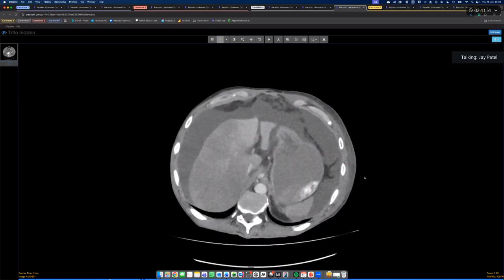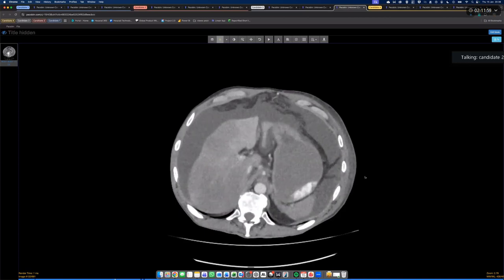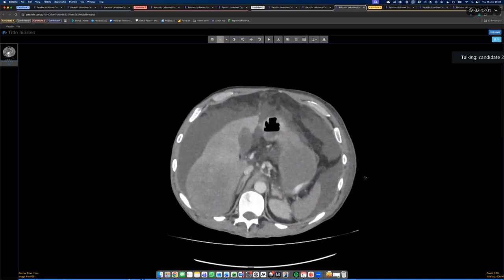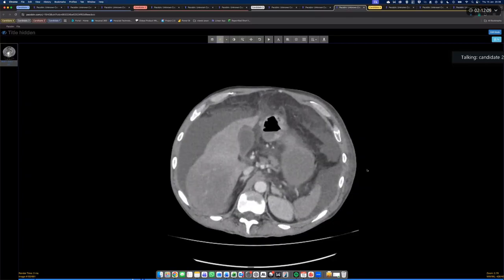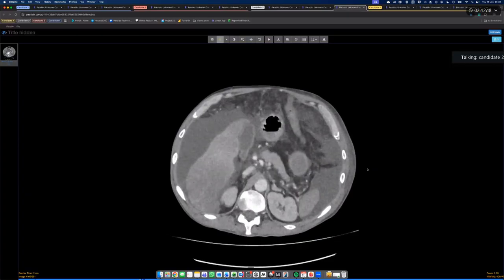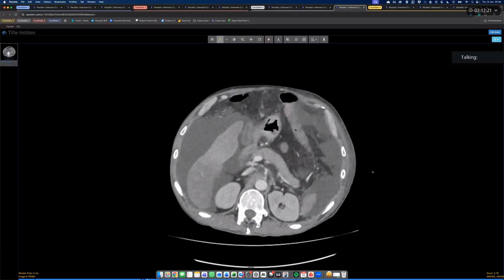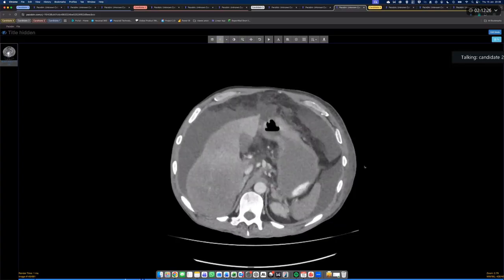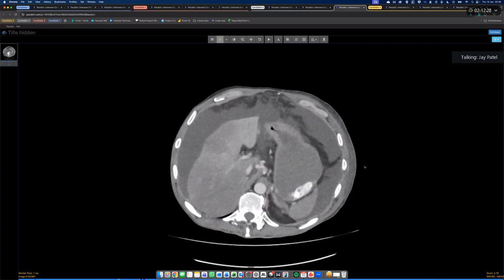How often have you seen a ruptured HCC causing hemoperitoneum? It's less common, but I'll confirm that on prior images as well. If the patient is not known to have any HCC, then that is, of course, not possible in this case. Then in that case, I'll be exploring other reasons for this hemoperitoneum. Good. Okay. All right, let me take over the mouse. Well done.